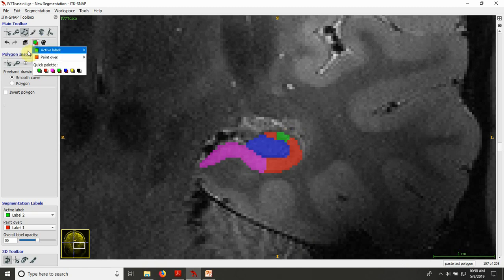And then the final thing again is the CA3 region in yellow. So if you look at the raw image here, you don't really see the endfolial pathway well. So you see maybe some voxels, but it's very faint. So I don't think I can use the endfolial pathway in this particular slice. And actually, if I cannot use it in this slice, I wouldn't use it in this subject or in the study in which this subject would be included. I just showed it for demonstration in the other slide. So for now, I'm just gonna use the geometrical rule.